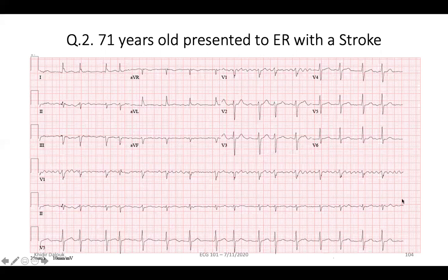I think the person who answered atrial flutter is mainly looking at V1 and at those wavy waves here, and that's why maybe he's saying flutter. And now I have, first of all, a rate of 96 in the answers as well. Okay, good. And why did whoever mentioned that say 96, and why did you say atrial fibrillation?